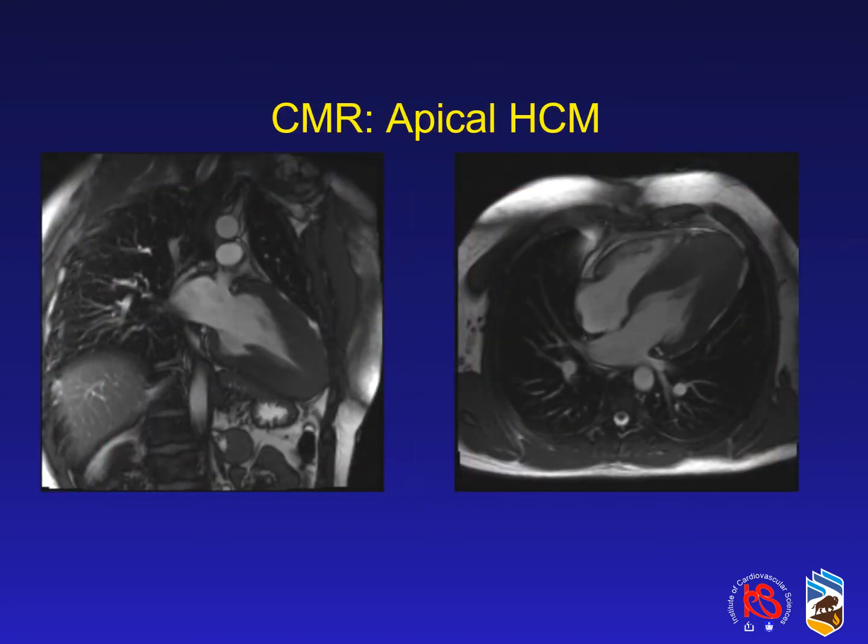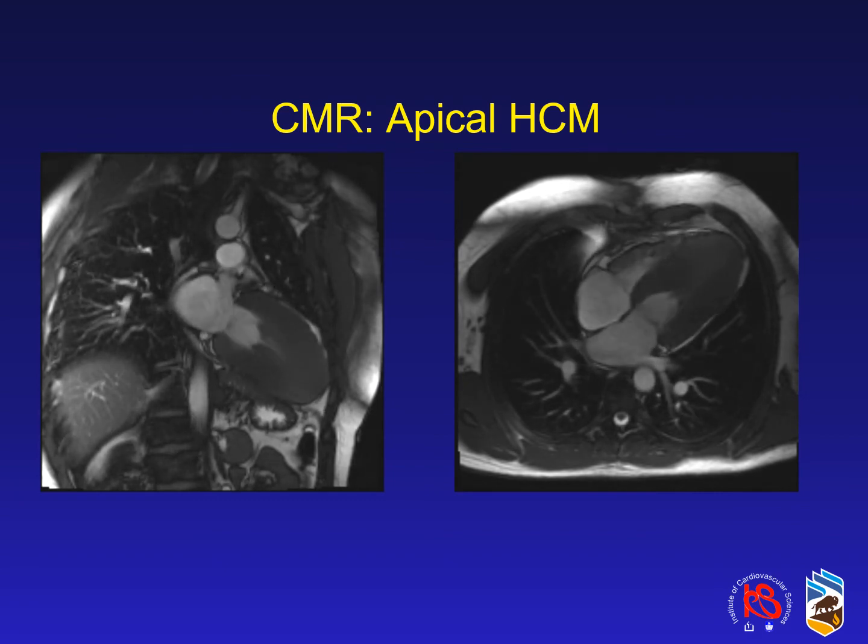And finally, on cardiac MRI, in both the vertical long axis view or 2-chamber view and the horizontal long axis view or the 4-chamber view, there is evidence of this ace of spade deformity present within the LV cavity with apical hypertrophy consistent with the diagnosis.